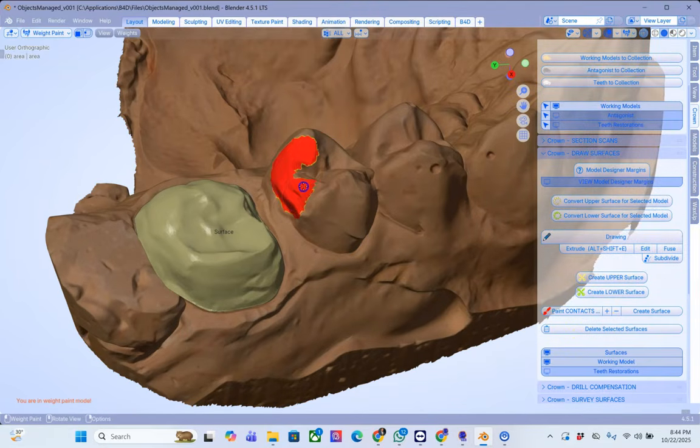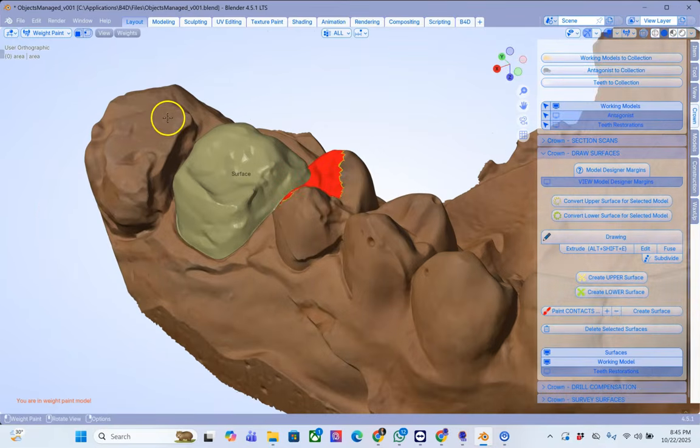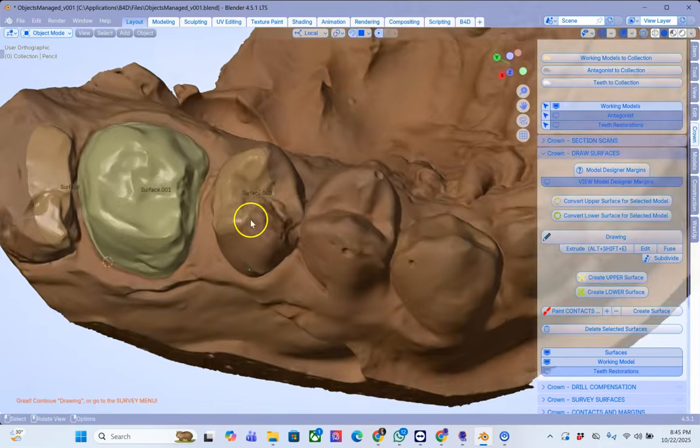And here I want you to paint it at an angle, so that it angles like that, not only the contact. This is actually quite important because it's going to make a block out object. That's looking good, and then we're going to create the surface.